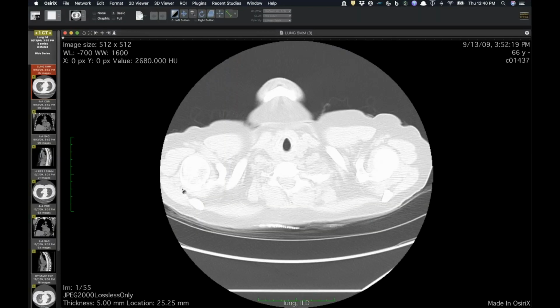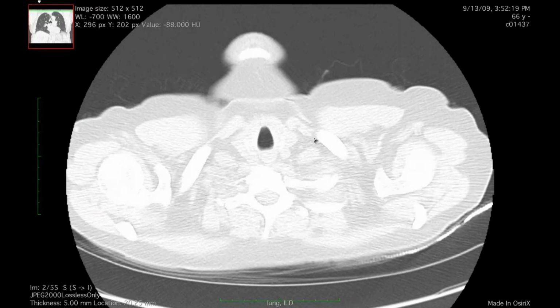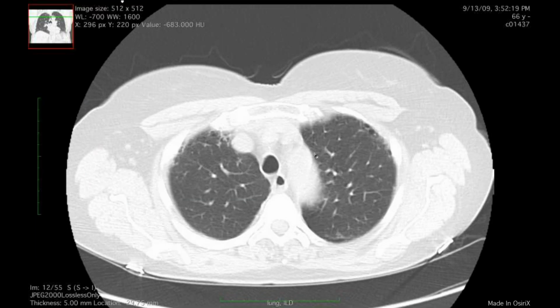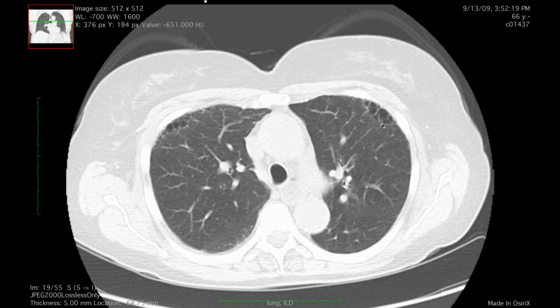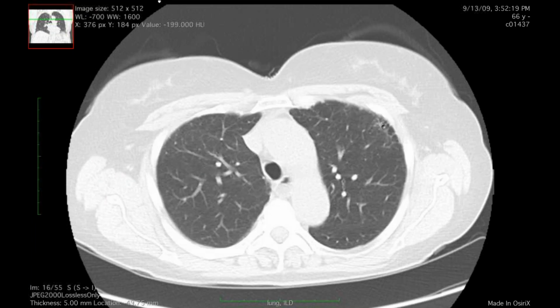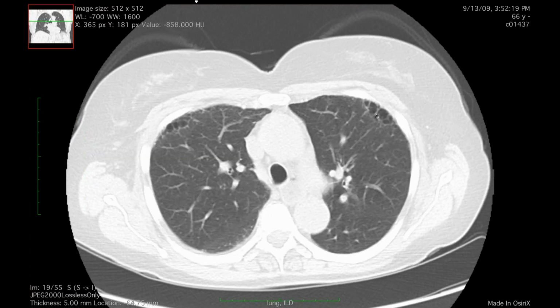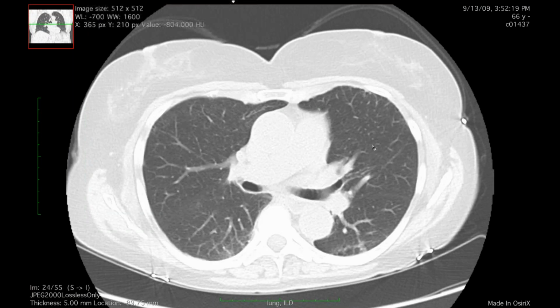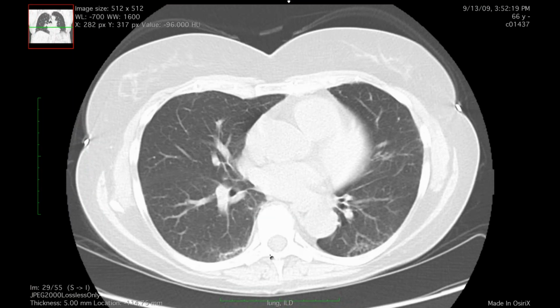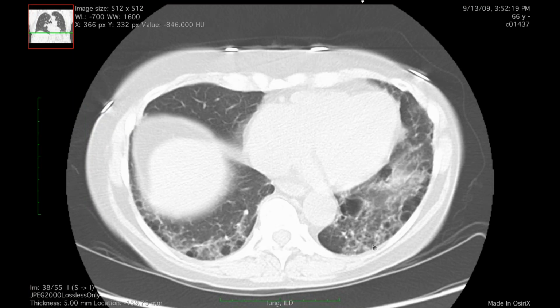Yes. And then I'll show this. So Seth, you're on here too, and we've got a lot of people I think that can help answer this. This is a 66-year-old woman. This is an interesting case because she has interstitial lung disease and was referred to us. She has anterior upper lobe subpleural findings, and you might say it's honeycombing. Some of them are a little bit larger and irregular air spaces. And then she has similar findings isolated to the posterior aspects of the lower lobes.